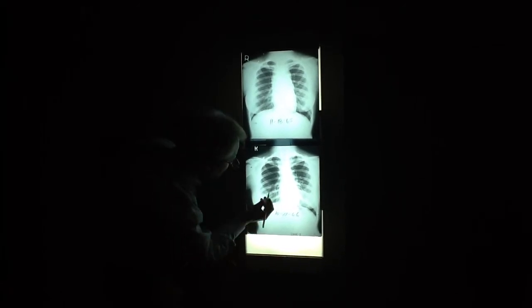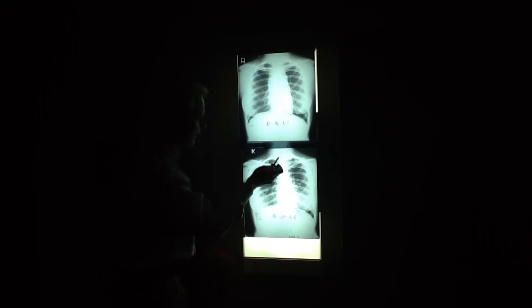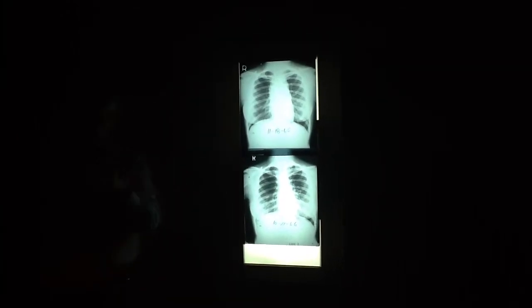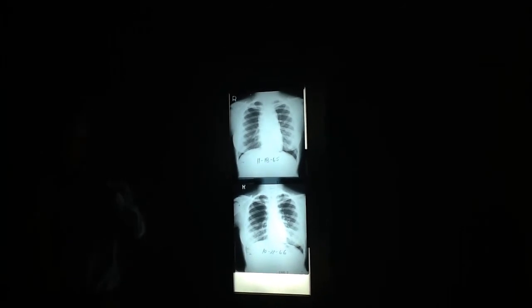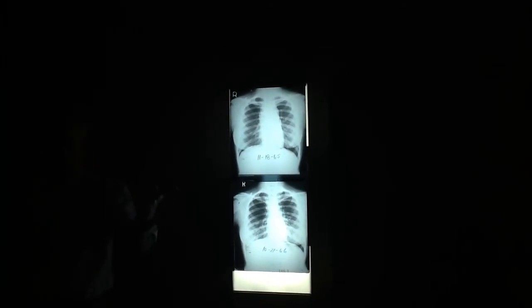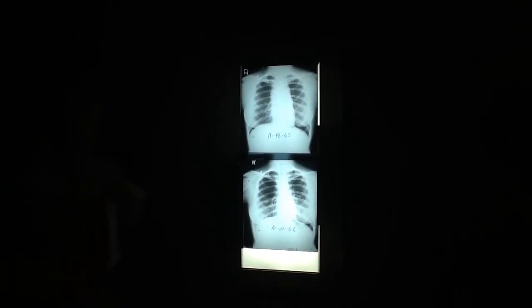If you look very closely, there are some little tiny cavities out here. One there, probably maybe one in here, little faint cavities. And that's the cancer cells actually retrograding. They're going in the opposite direction from the lymph nodes. They're retrograding through the lymphatics, and it's causing little small focal cancer areas out in the lung, and they're cavitating.